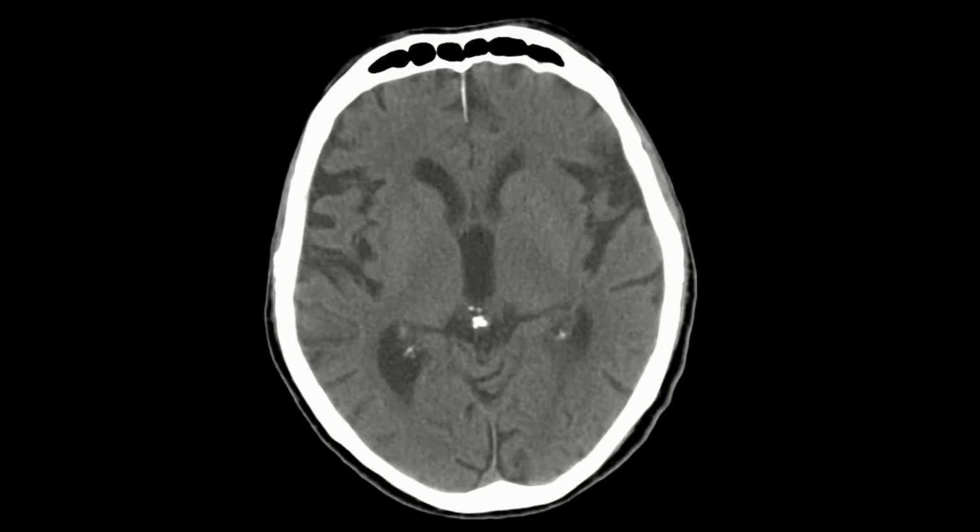We will conclude this tutorial with a discussion on calcified structures. So if you remember, I had said earlier that the choroid plexus undergoes calcification with age. It is important that you know what structures undergo this degenerative process, given that they might be mistaken for, say, intracerebral hemorrhage. So we already saw the choroid plexus. You can see bits of it over here within the posterior horn of the lateral ventricle, mild calcifications.